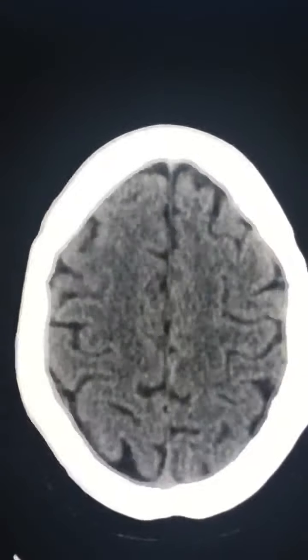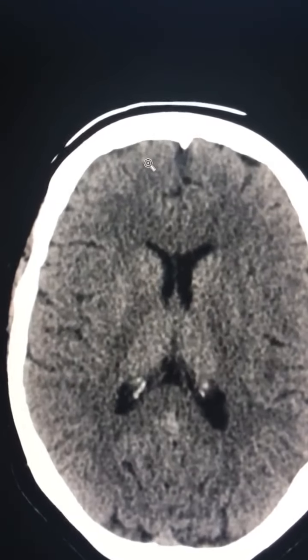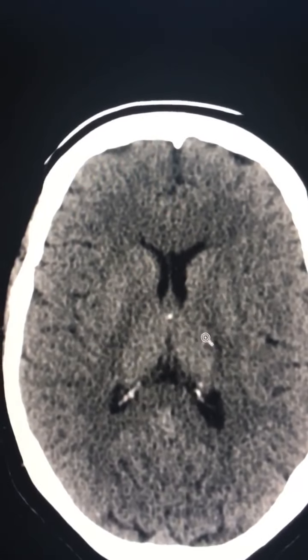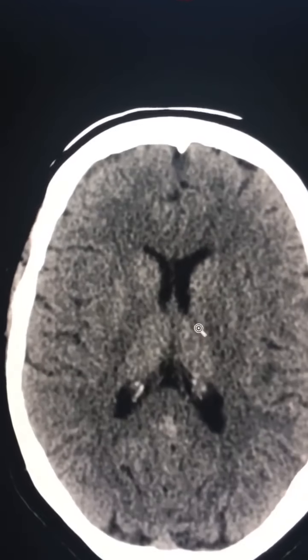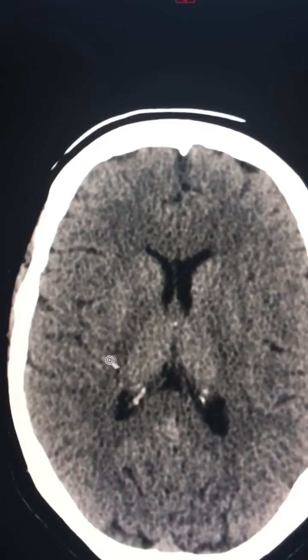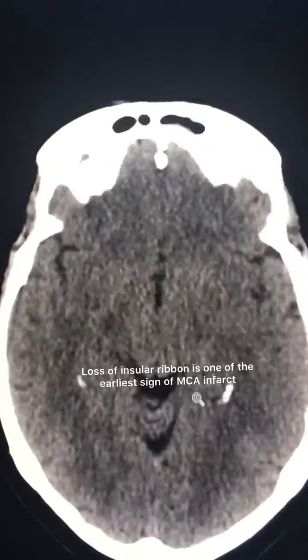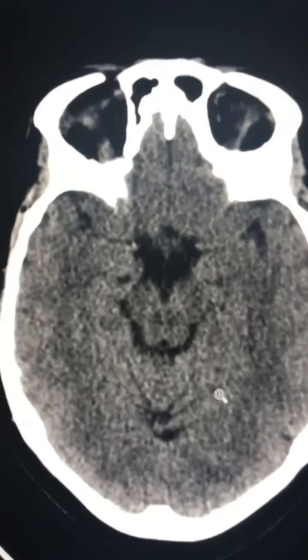After covering all, go at the top again. Stroke or lacunar infarcts are very common in the area of the basal ganglia and thalamus. Look at these areas once again to make sure you are not missing anything. So look at the insular cortex, the internal and external capsule, caudate, thalamus, globus pallidus, putamen on both sides, and make sure you are not missing any stroke in this area.